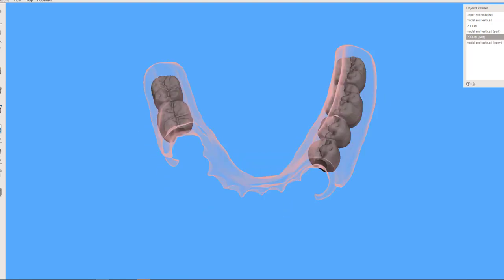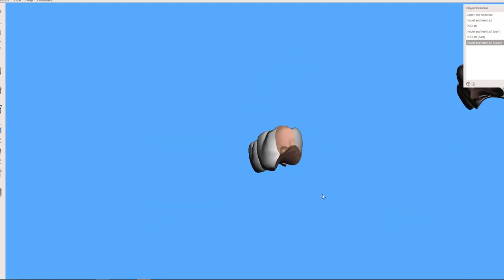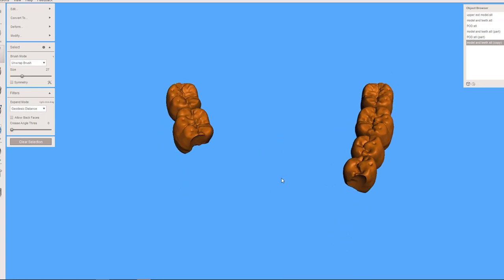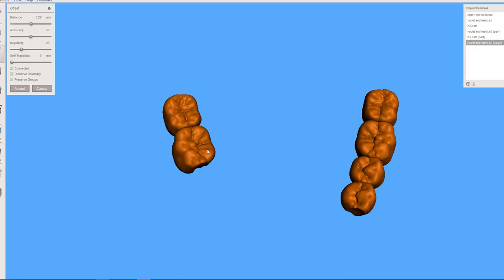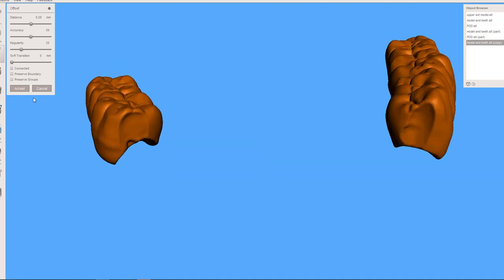What would be better is to go ahead and take all of these surfaces of the teeth. I'm just going to hit Control A, which selects everything, and I'm thinking about how much of a cement spacer I want between teeth and base. The denture module, I think, defaults to 0.2 or 0.3. Let's just, for the heck of it, go 0.25. We'll split the difference. Well, that took a minute to think, and I don't want to wait again. It's at 0.28, so I'm just going to roll with that.